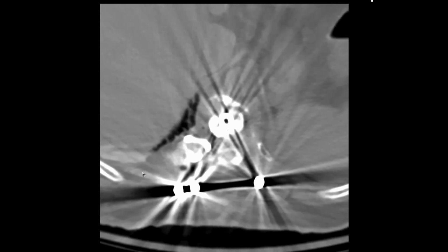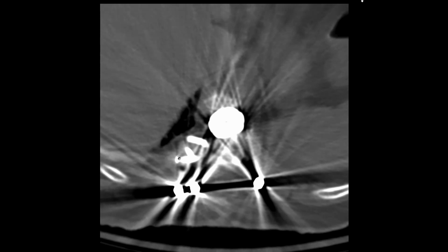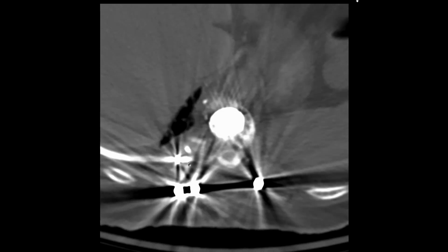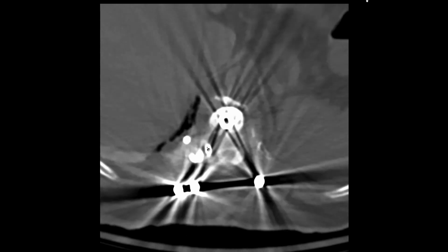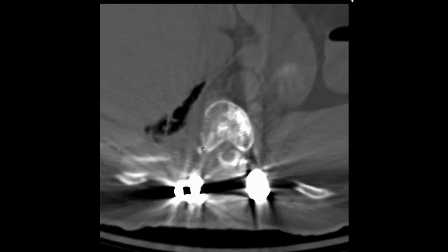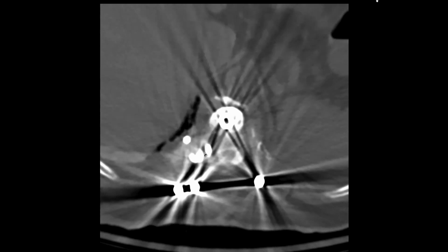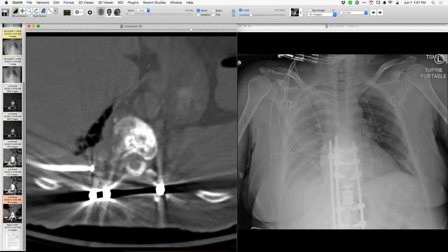Okay, so here is a pleural drain right there. And they described seeing some contrast communication between what you see here, tracing it in towards the spine, and they diagnosed the leak at that level. Maybe an image like that is where we can see this contrast medium close to the pigtail catheter and then going in that direction in the pleural space.